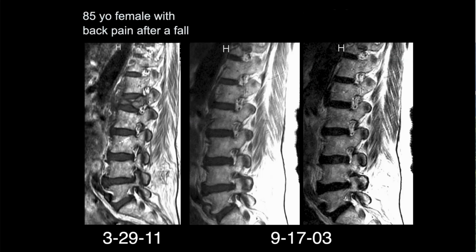Now this is 9/17/03. Everybody waiting with bated breath? Oh, it didn't come up. There we go. What's that? Hold it. Oh, no. This is before. Okay, so that's what it looked like before. Just to prove to you. Thought it was a miracle.